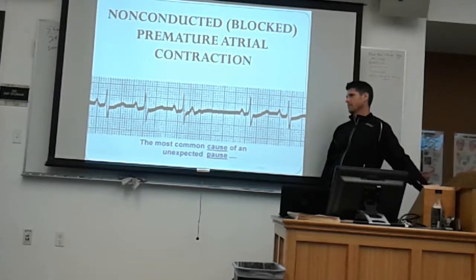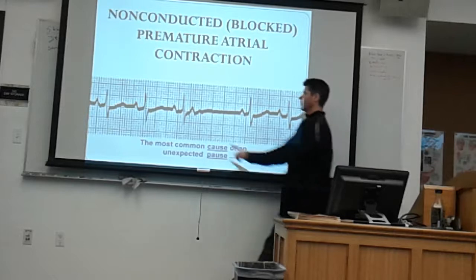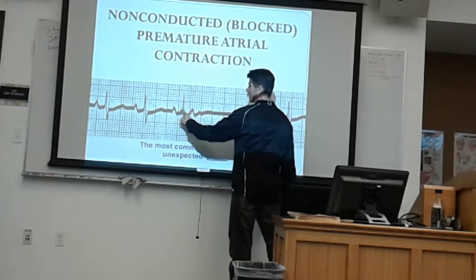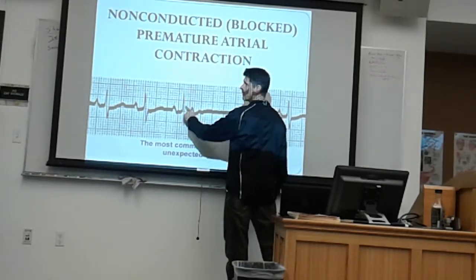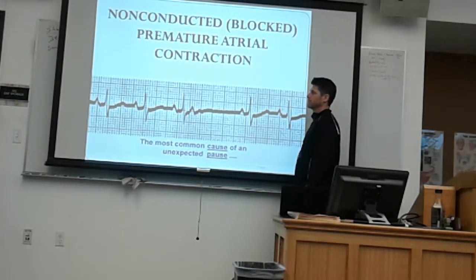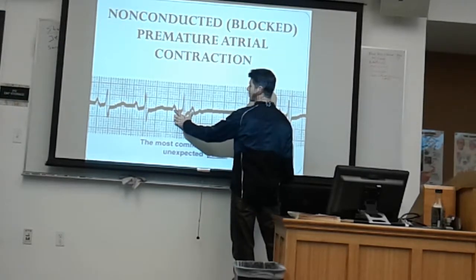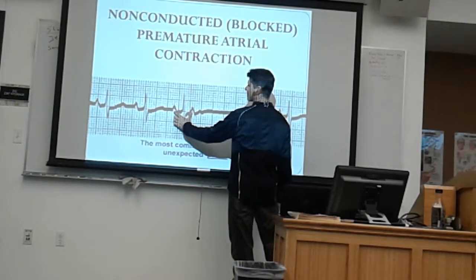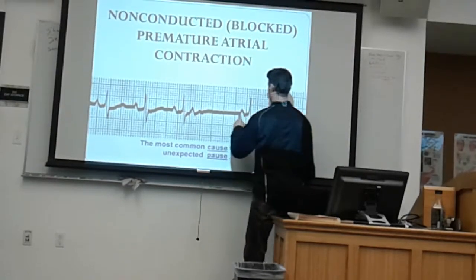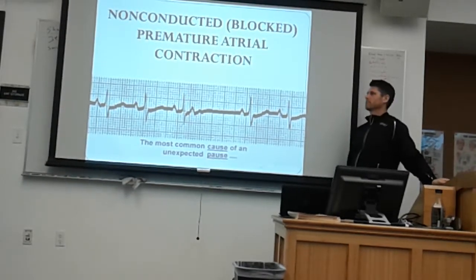What are you looking at when you're saying that looks like a P wave? I'm looking at the P waves and just comparing it to that. The P waves are pointy versus the T waves are round. Do you not see a similarity in those two waves right there? Compared to all the other waves that are there?